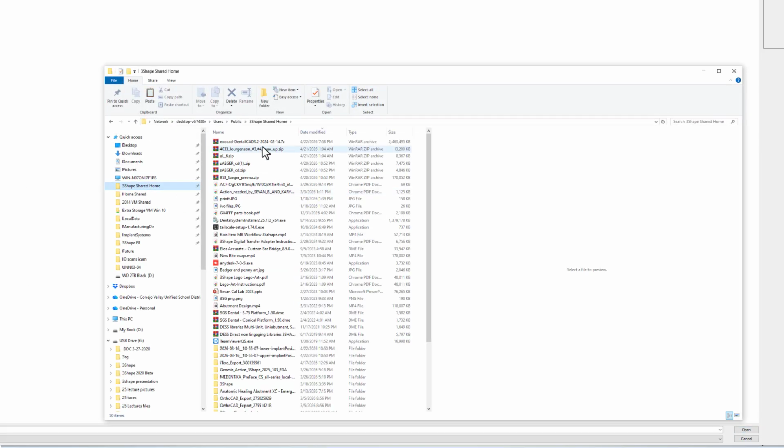I apologize. I'm going to now go. It doesn't like, it doesn't like to apparently make this screen any smaller. So I will show you where I'm going.